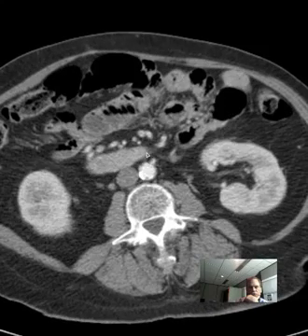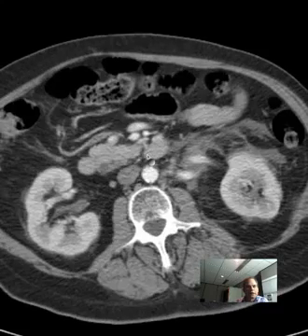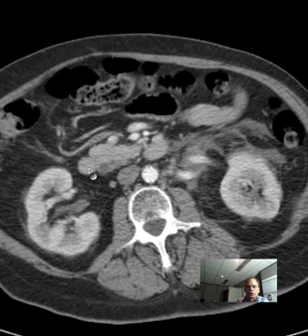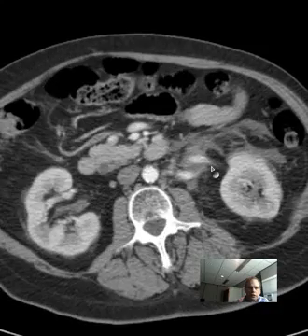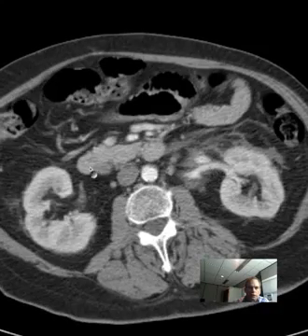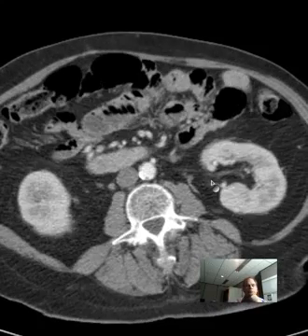And if you go farther, you see the transverse or third portion of the duodenum. You go up, back again, and here you have the second portion of the duodenum, which is the vertically oriented portion. And if you look at this common bile duct and watch closely, it just kind of disappears right at this level as it merges with the second portion of the duodenum.